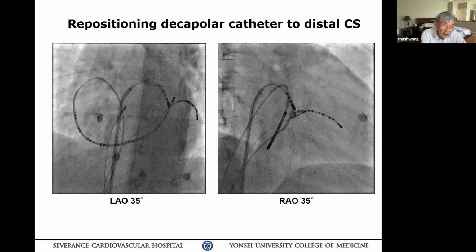But on the other hand, AVNRT is a driving one, then you're not terminating. Yeah, AVNRT doesn't really care what it does. Okay? So I think those are simple maneuvers that you can think about. But your cardiac vein pacing I saw is a beautiful one, except I think your output may be too high.